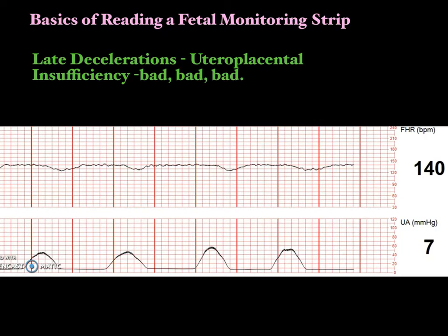And when we draw that line straight down, I know that wasn't necessarily the straightest, we see that the deceleration begins somewhere in the middle of that contraction. Often it will begin at the peak, okay? And it can resolve either during the contraction or when the contraction ends. Sometimes it takes a really long time for that baby to recover. But that is how you know it's late. The deceleration has a gradual descent down to the bottom.